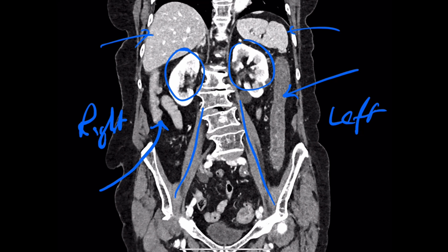So, from a radiological point of view, we might be able to guide the clinicians to what type of colitis it might be, depending on the pattern of spread. So in this particular image, we can only see left-sided colitis, and there's perhaps a bit of sigmoid colon which has been caught in the view that it's inflamed as well. We'd have to see the whole series, but it looks like a left-sided colitis, perhaps continuous.